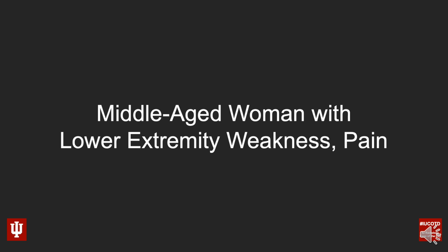Okay, so here's the history for this case. This is a middle-aged woman who presented with lower extremity weakness and pain. And this presented fairly rapidly, sort of crescendoed over several days, maybe to a few weeks in time. But again, middle-aged woman, lower extremity weakness and pain.